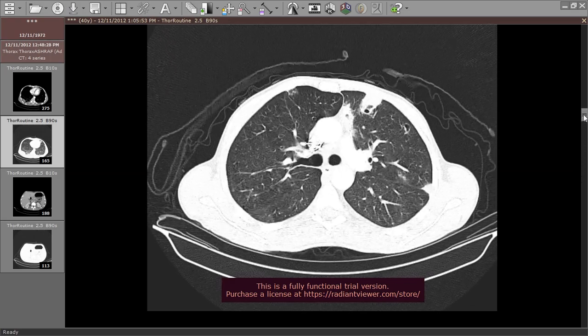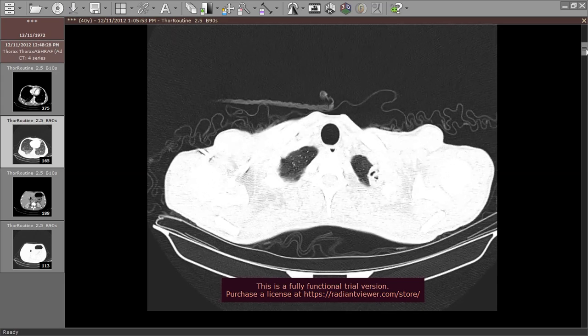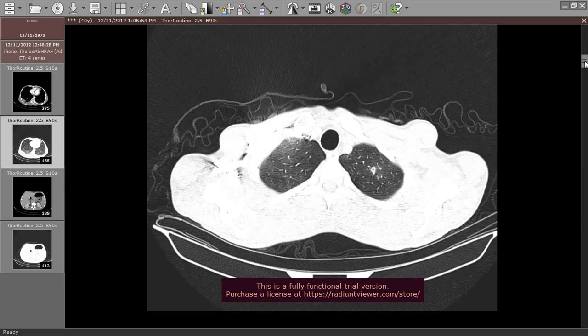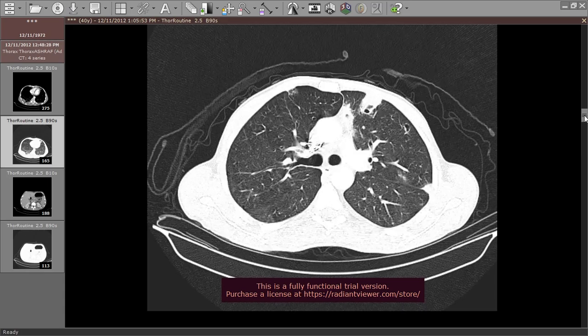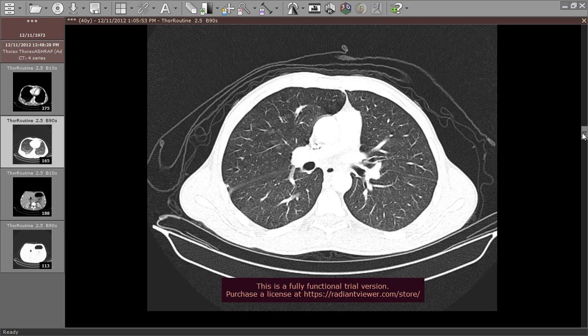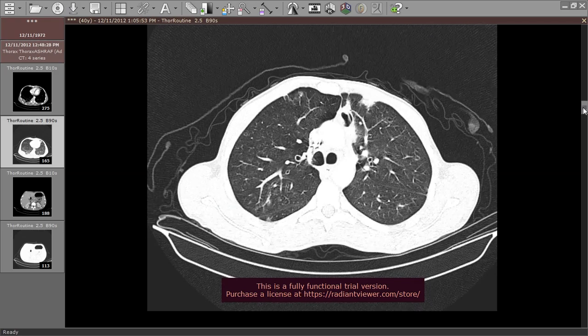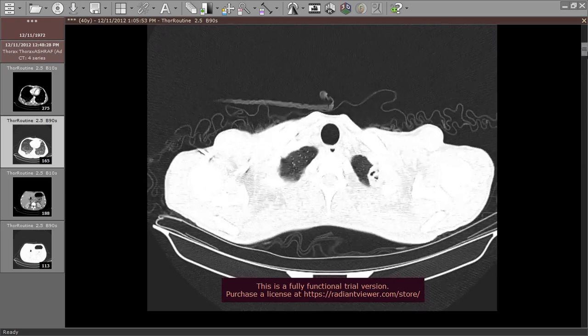With this history, these typical lung abscesses are called septic emboli. It is emboli because this is pulmonary showers, but it harbors the microbial organisms towards the pulmonary circulation, then towards the lung, causing these infarctions which are septic, infected.